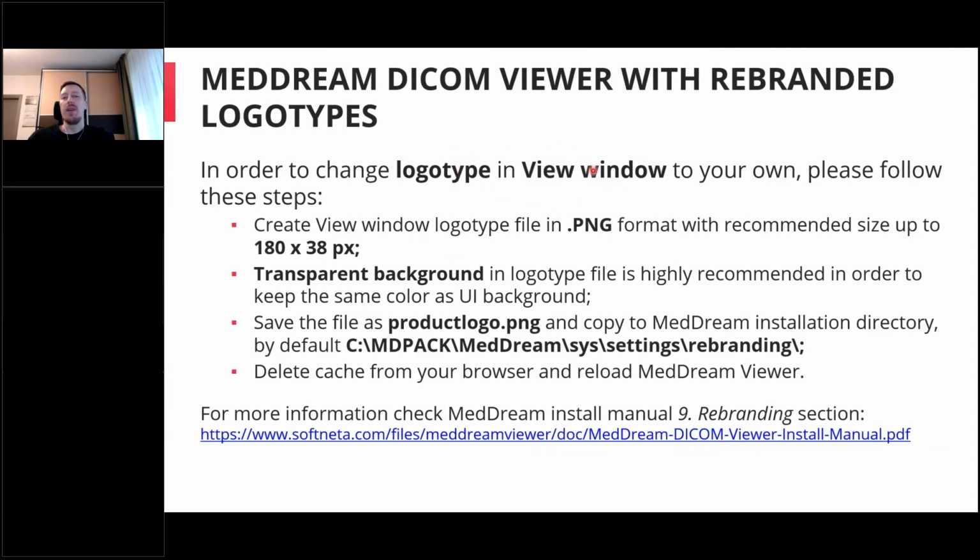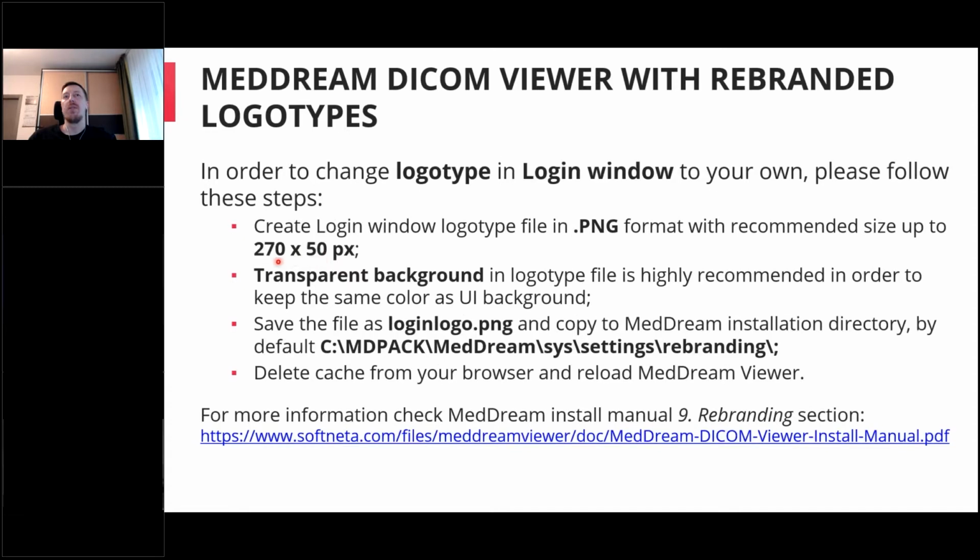The same can be done with the logo which is displayed in the viewer window when you are viewing a study. Just to check here, the recommended size of the viewer logo is different compared to the login window size.